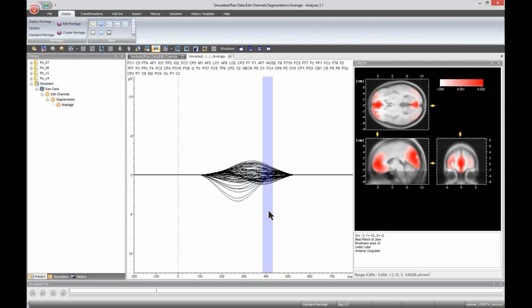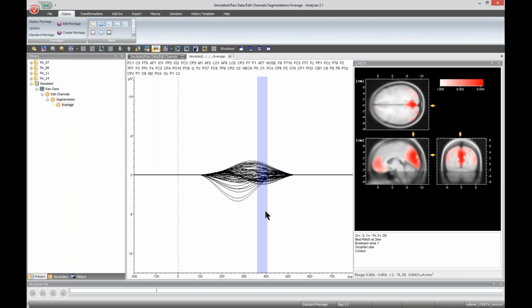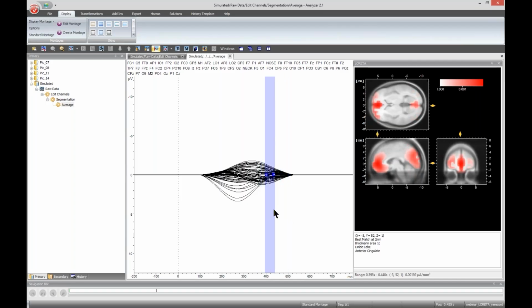And then when I'm about to leave, where the contribution of the occipital source is not anymore there, the occipital source dies out, and then the frontal source dominates. Okay, so this way you can inspect your EEG data. So LORETA as a transient mode enables you to inspect your EEG data and have a first impression about the location of the activated sources.